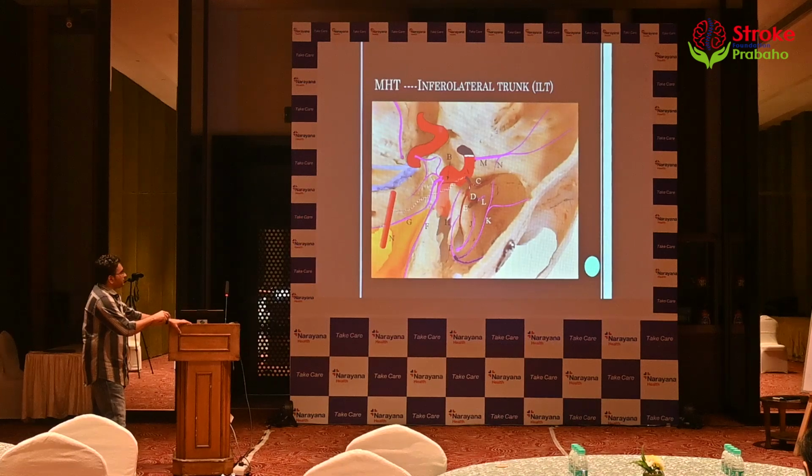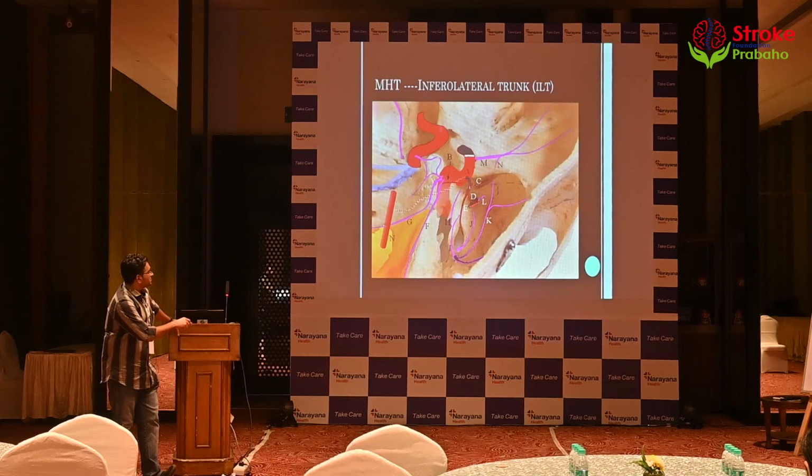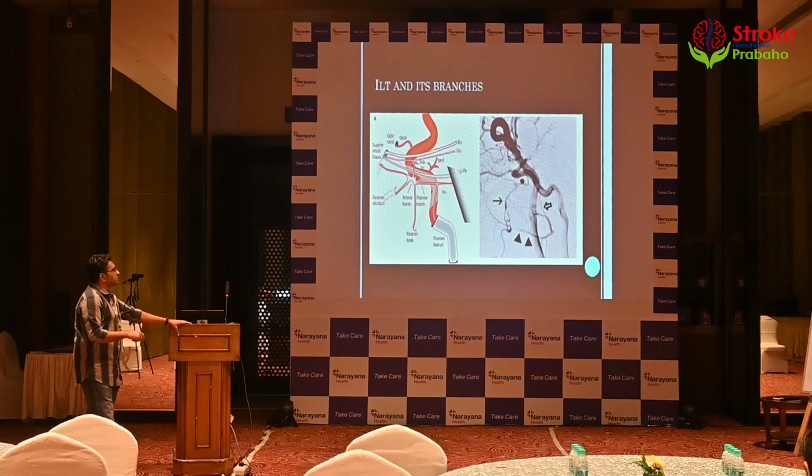What would the dotted line represent? It goes to the basilar. So that's the PTA, which we have not spoken about. This is the persistent trigeminal. So you can have a mental framework of the level from which the origins arise and how to identify them. These are examples of showing the same thing in specific locations.